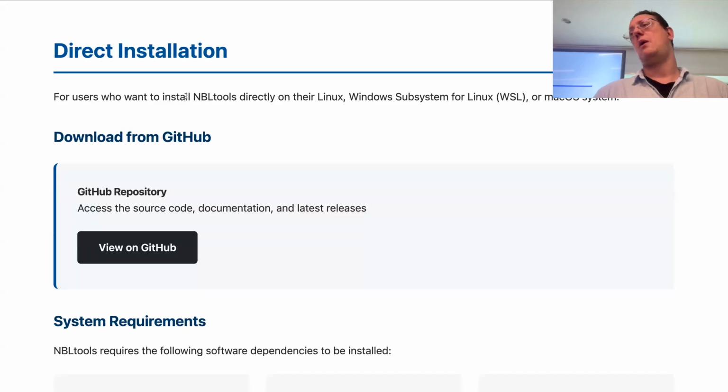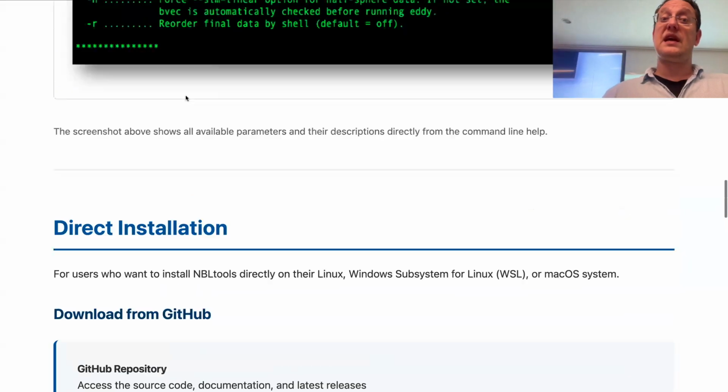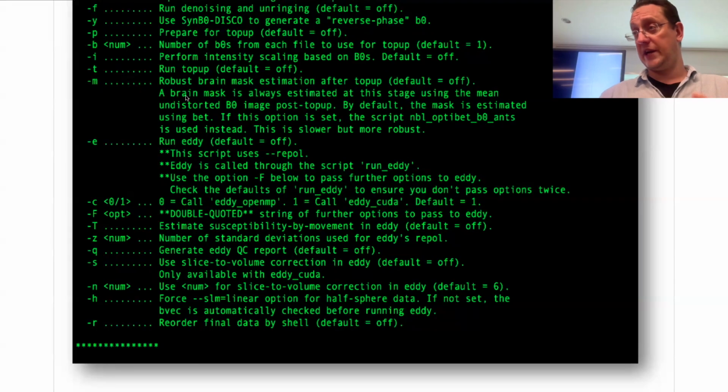One patient takes roughly 1 hour, because, as I said, some steps are not optimized. My suggestion, if you have a server, for example, with Linux and a GPU like a CUDA card, is that the half hour or hour will come down to 20 minutes. This is because Mac doesn't have a GPU that is compatible with CUDA, it doesn't have an NVIDIA card. So if you have an NVIDIA card with CUDA, it will run much faster.